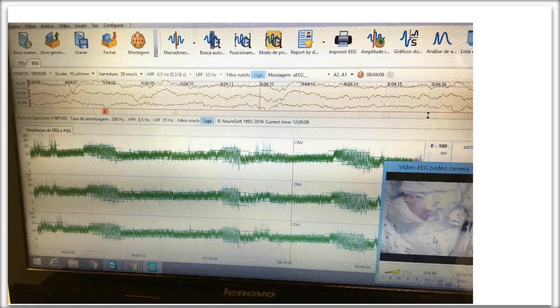So he uses a different kind of device, so you may have not seen this kind of an aEEG before, but this just goes back to the conversation from last month that aEEG is just amplitude integrated EEG, can come in the form of many different monitor types.